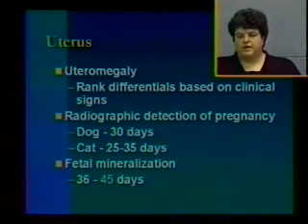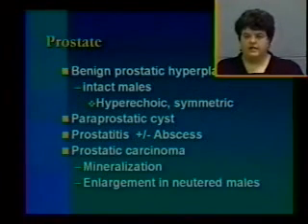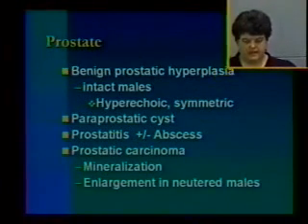Radiographs are also the best way to count fetuses. That's not a number that can be definitively called on ultrasound, so you really need to radiograph animals in order to count how many babies they're going to have. Finally, we're going to end with prostate.